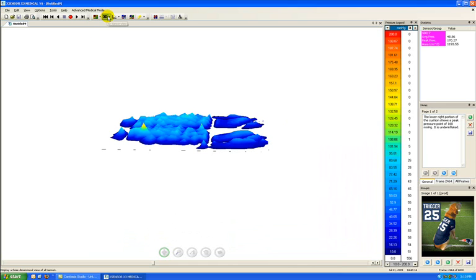Also under the 3D mode, I'm able to switch to a chair configuration. So if I have 2 sensors attached that form a back and then a seat, I'm actually able to see them in 3 dimensions in that configuration. That is, I can see the back in 3D, and I can also see the seat in 3D, and so I can see how they're positioned vis-a-vis one another.